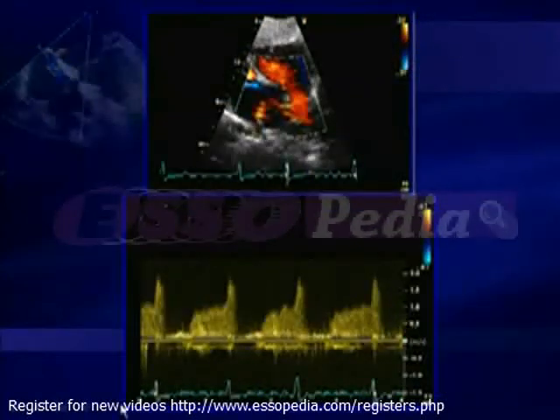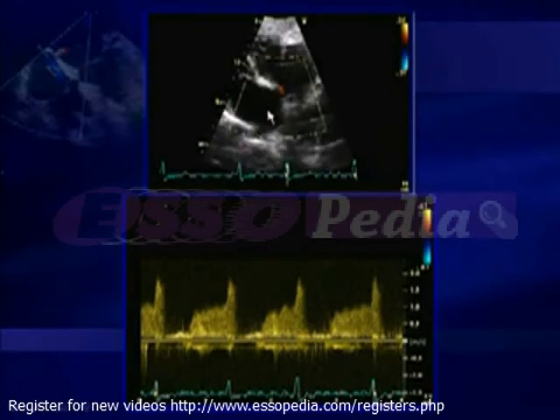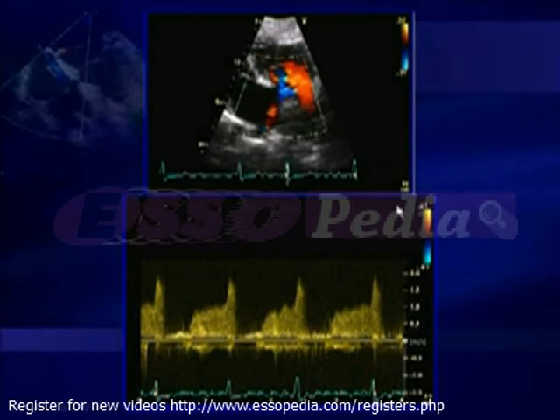We were reminded too to look at all other possible ancillary findings. Here this patient has an atrial septal communication. If we look at the Doppler velocity profile, we see that the velocity between the left atrium and the right atrium is close to 2 meters per second. So apply this to the modified Bernoulli equation. It gives us a gradient between the LA and the RA of about 16 millimeters of mercury. If we then add some estimation of RA pressure, this suggests that the LA pressure is significantly elevated.